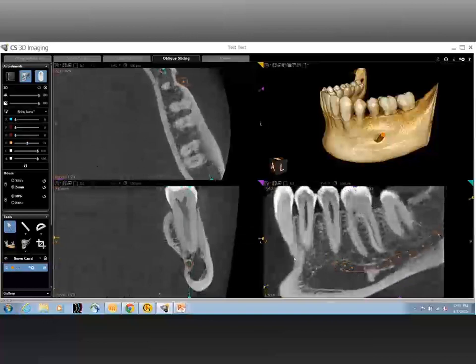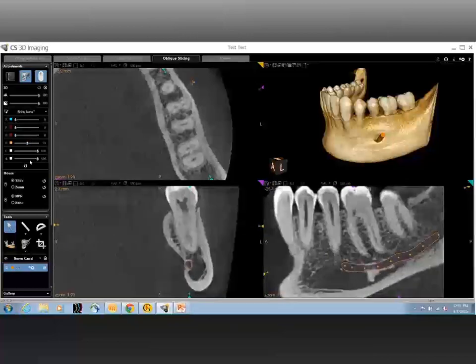You can also visualize it if you look at the axial structures where you see the pulpal horn. If there are any missing canals, you can identify calcified canals or even calcifications within the canal, certain isolated calcifications, pulp stones, or various other things. And so, at the apex of the teeth, I'm sorry. Go ahead.